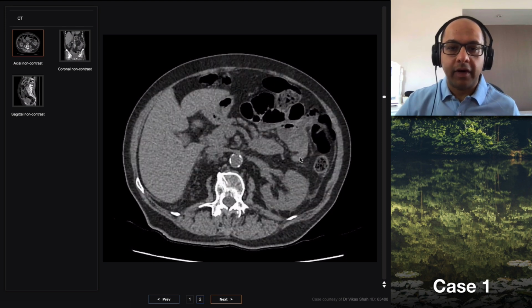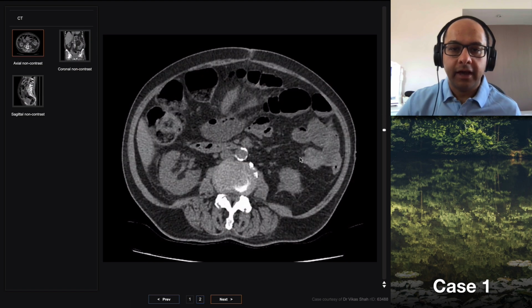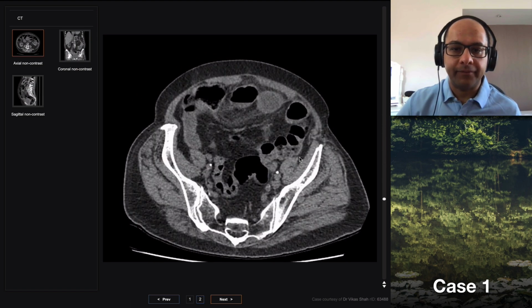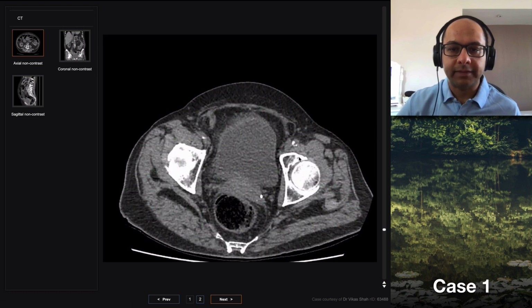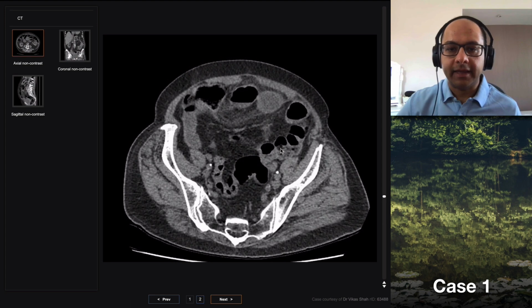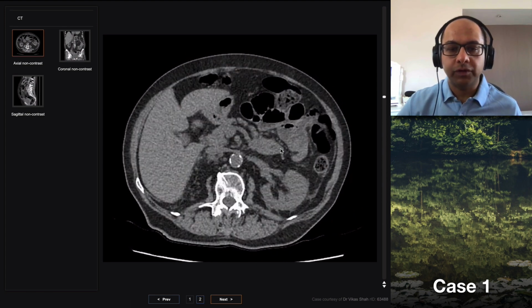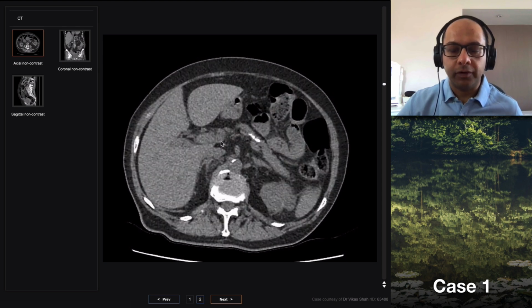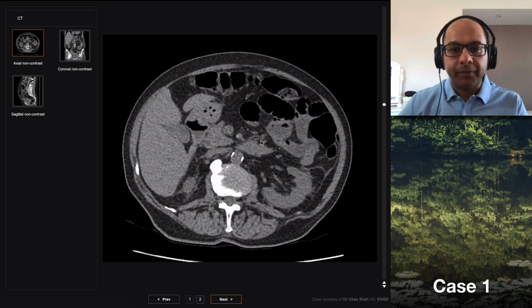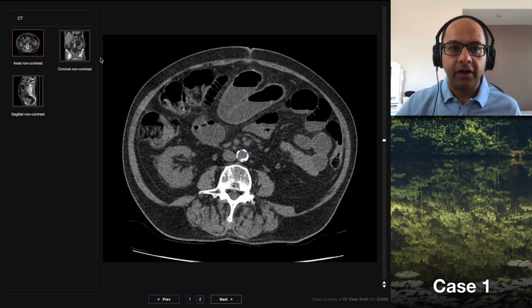So we know that in other parts, for example, if you're looking at the femoral vessels on a CT, and you see that one of them unilaterally is hyperexpanded and the content is hyperdense and there's some fat stranding around it, that would be strongly suggestive of deep venous thrombosis. I think it's slightly trickier though with mesenteric vessels and particularly the portal vein to make that call.